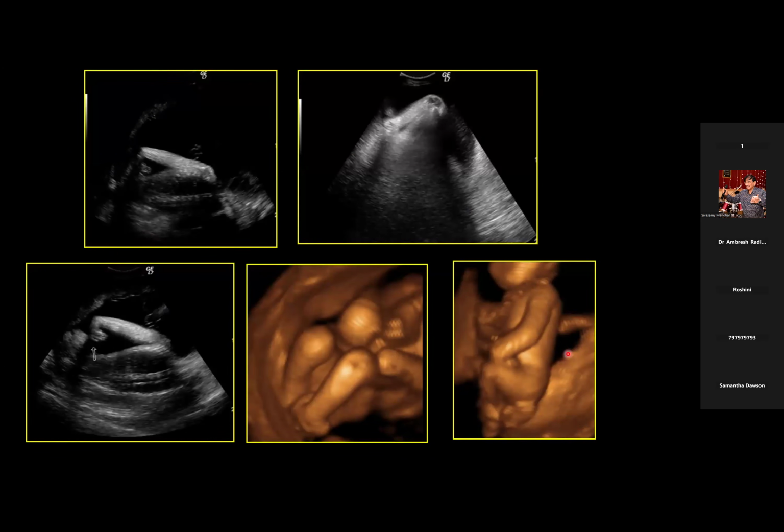You can see pronated forearm with persistently flexed wrist here, an abnormal position of the foot also here. And you can see there is reduction in the muscle mass and the soft tissues show increased echogenicity because of the diffuse fibrosis. So this is also a case of arthrogryposis.